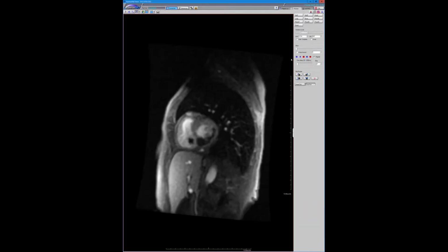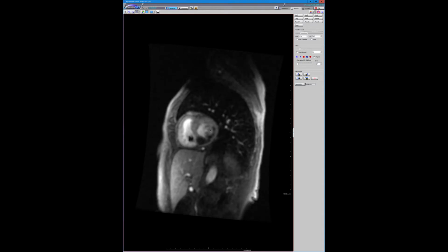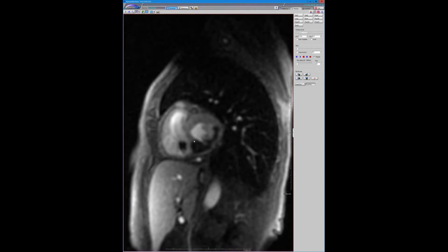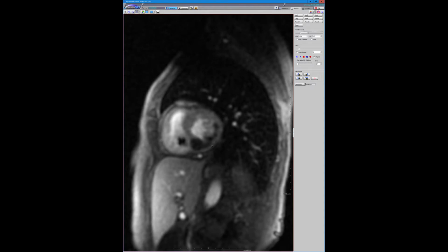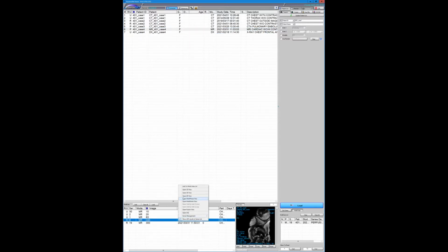Because this is a cardiac MR, obviously, and this was the perfusion scan, and you can see that on the perfusion scan, she had a device in. You can see there's a pacemaker here. There is this large ball of basically absent perfusion extending through the myocardium, and initially one of my younger faculty showed me this, and I was just trying to wrap my head around what it could be. Was it related to an infarct?